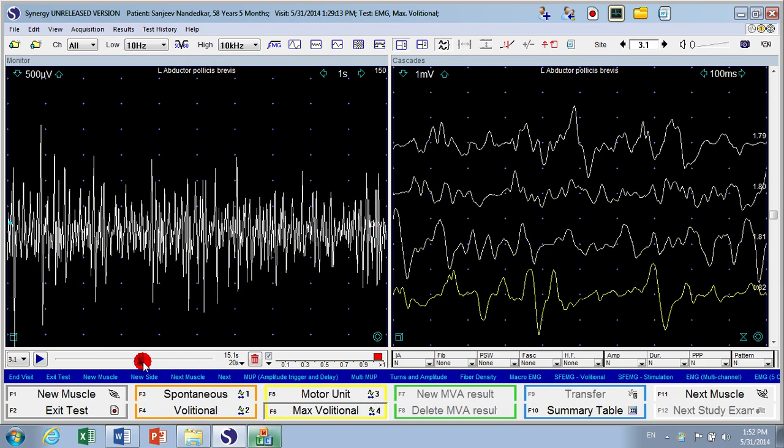And again, we can see the signals. If you like something that you believe is worth putting in the report, just click into the window over here and then transfer traces to report. Keep in mind that we cannot transfer the monitor traces into the report. We cannot do that. Hopefully in future. Okay, so this is the way we have established the review process.